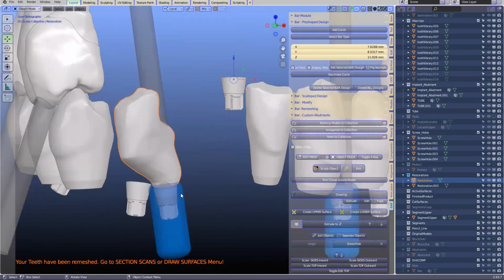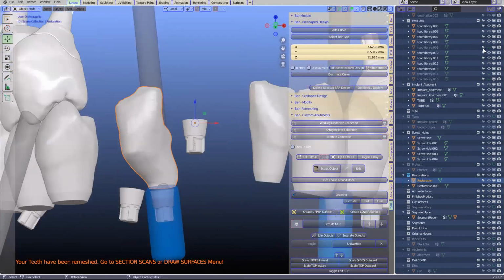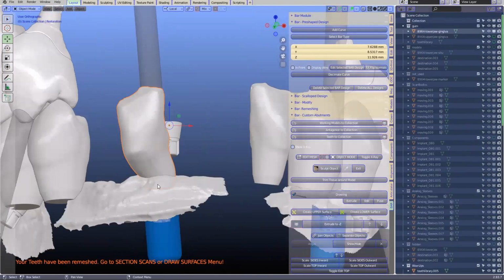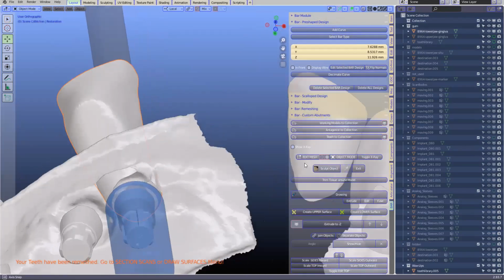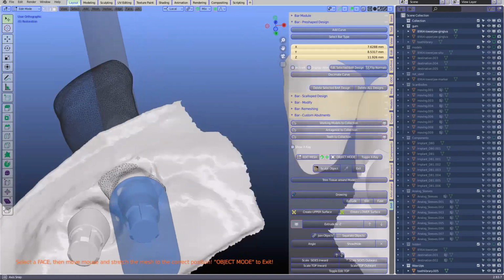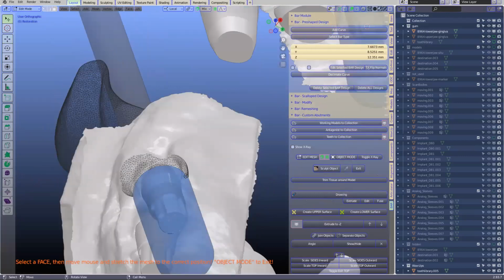So what I'm going to do is we're going to go into the crown module, and no, not yet. It's not yet. We need to outline it. So here, and again, this time around, we want to line it on the inside. So edit, magnet tool on, and I'll just bring that out a bit like this. Like that.